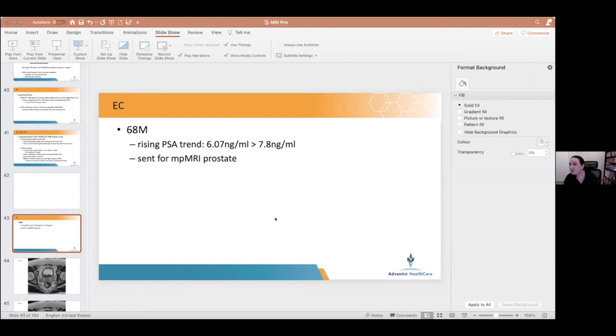Mark, I find that fusing with the MR really helps. You think you can cognitively fuse, but it's difficult. And I think when you do fuse them, those grey areas or the physiologic normal PSMA uptake in the central zones and PSMA excretion in the urethra, all those things become very, very easy to identify. And I think that the subtleties, I find it much easier having them overlaid.